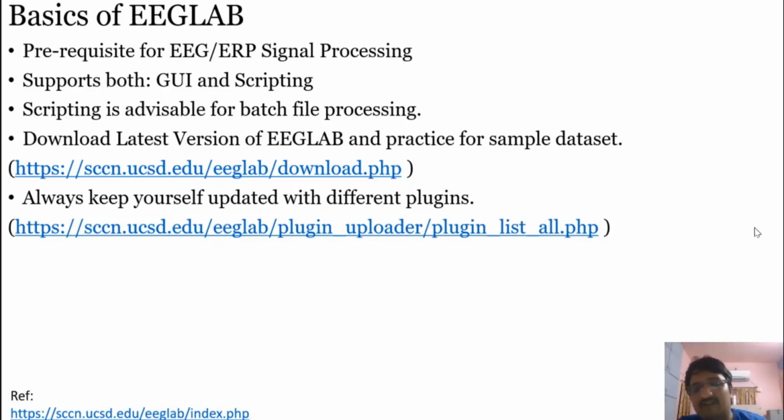One last important thing is plugins. In the demonstration, I will show you that there are many plugins which are already available with thousands of downloads and various applications. Many of them are still in progress and getting updated with more and more features.